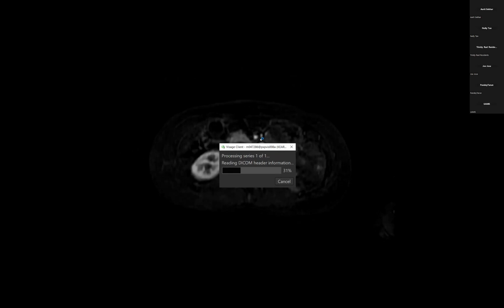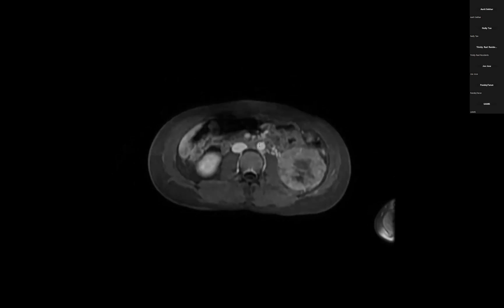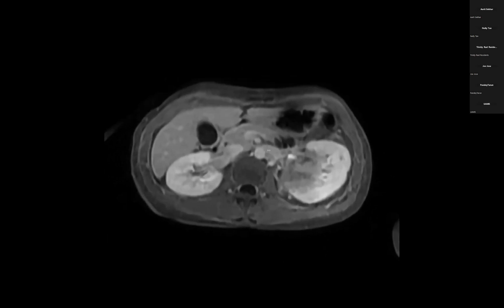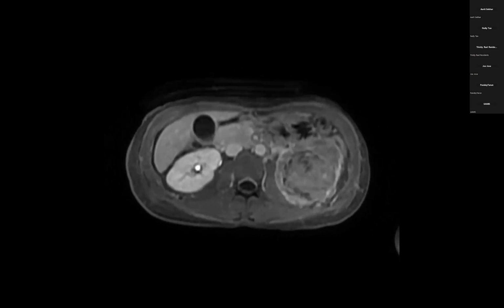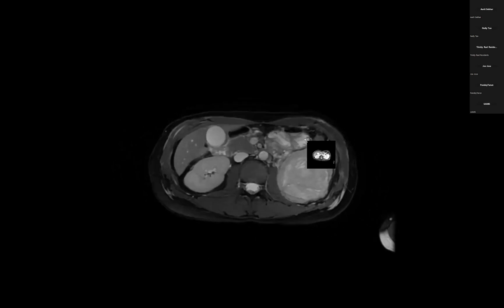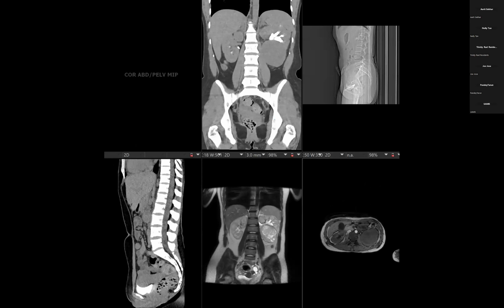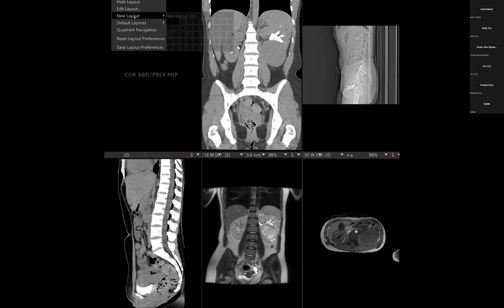Okay, I'm just going to go through the thought process for the residents. Normally clear cells tend to have central necrosis, arterial enhancement, and washout. So that doesn't look like this. Papillaries can be T2 dark, hypoenhancing, or hemorrhagic masses with a papillary frond with hemorrhage. Doesn't look like that. Chromophobe or oncocytic neoplasms can have a central scar. They tend to be more kind of bland. So I was thinking about that with this bland appearance, but I don't see the central scar.